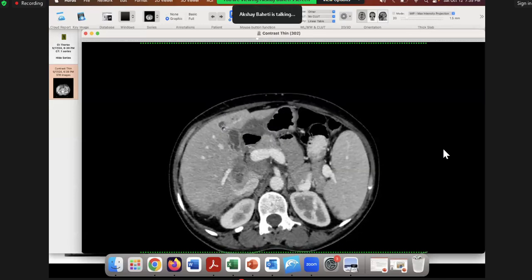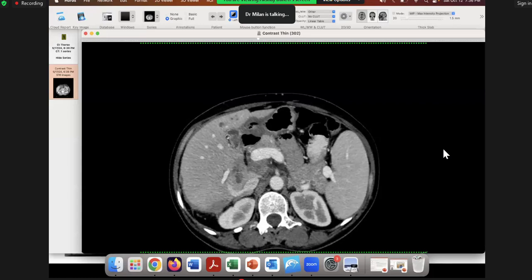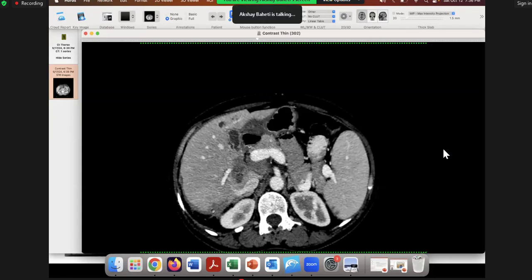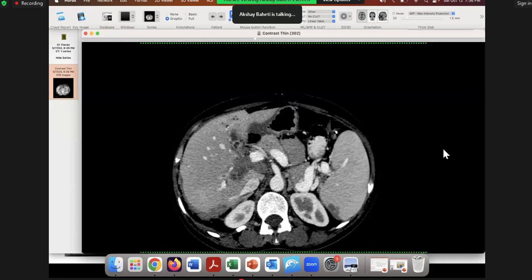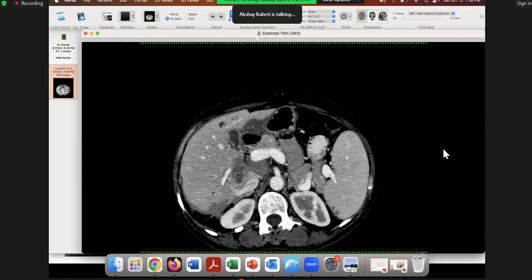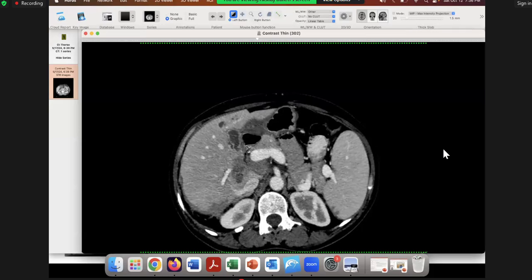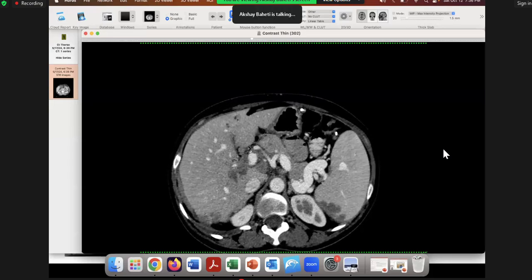So this deposit, is this cyst? What do you think? This is intraparenchymal. Yeah, but is this deposit or cyst? If you look at it, now I'm windowing it, this is gray and this is black. So are you certain this is deposit or can this be cyst? That we don't know. It could be cyst also, right? But let's look at other. Yes, sir. This one I am not very sure of, because I see this is all gray. I hope this is projecting well. This is gray, and this is not that gray. It's black, so it is fluid. You will always want to give benefit of doubt to the patient. So when you're not sure, you will want to give benefit of doubt and not call it met.